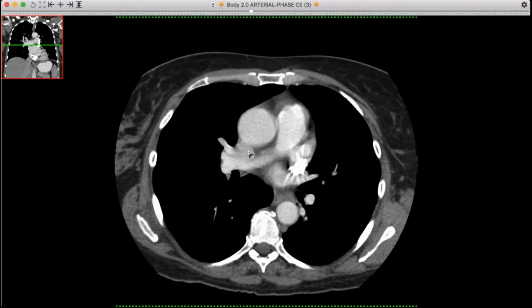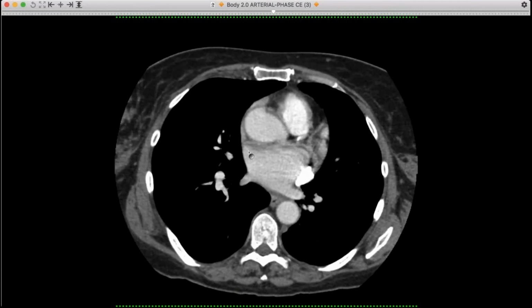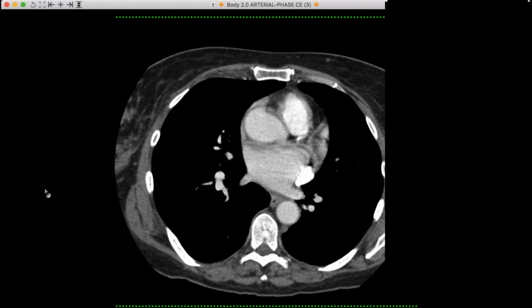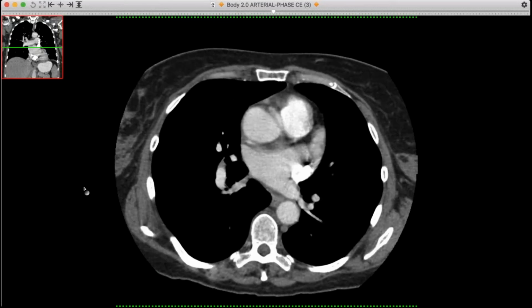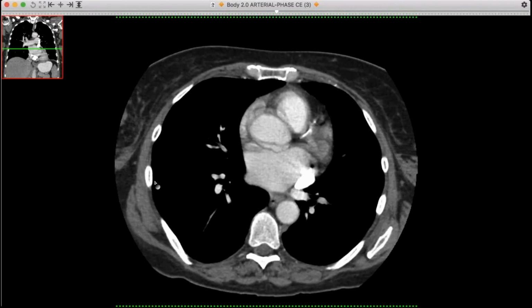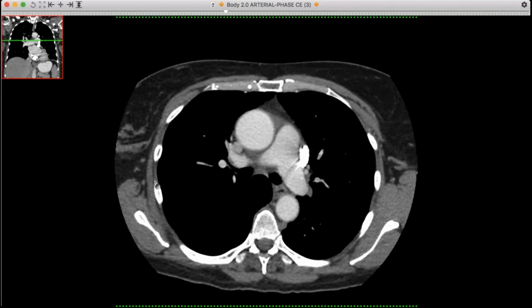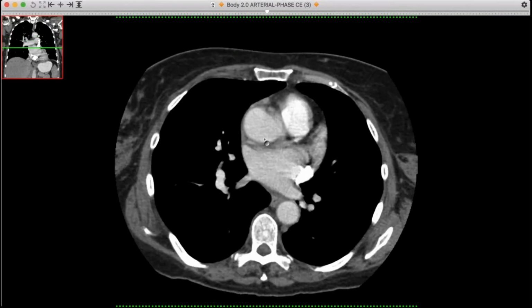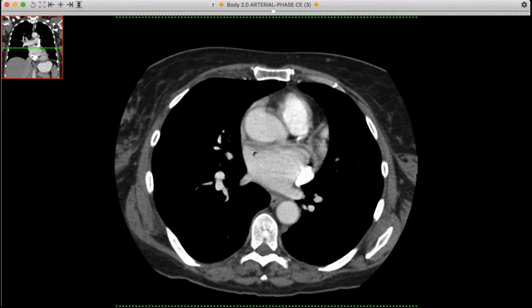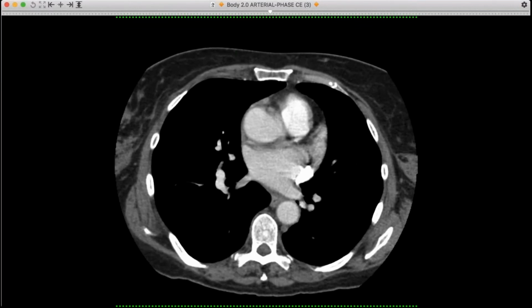So it's an anomalous drainage to the SVC without the atrial septal defect, but there's still a shunt. Of course, it's going to be a left to right shunt. No, I'm sorry, it's going to be systemic. Sorry, right to left shunt, backwards there. So this is why he was having the neurologic symptoms. Little clots and whatnot were flowing up to the brain.